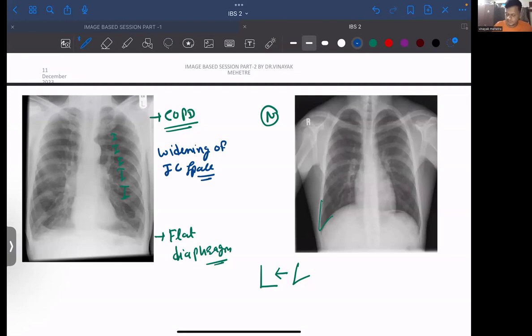And take a look. In this X-ray the lungs look small, the whole rib cage looks small. But if you take a look at the COPD X-ray, it will look broader, bigger, right? So there you will see a broad X-ray. This X-ray can come in the paper too, and this is the X-ray you are going to see in your practical day-to-day life. Okay, not everything is just for the paper.